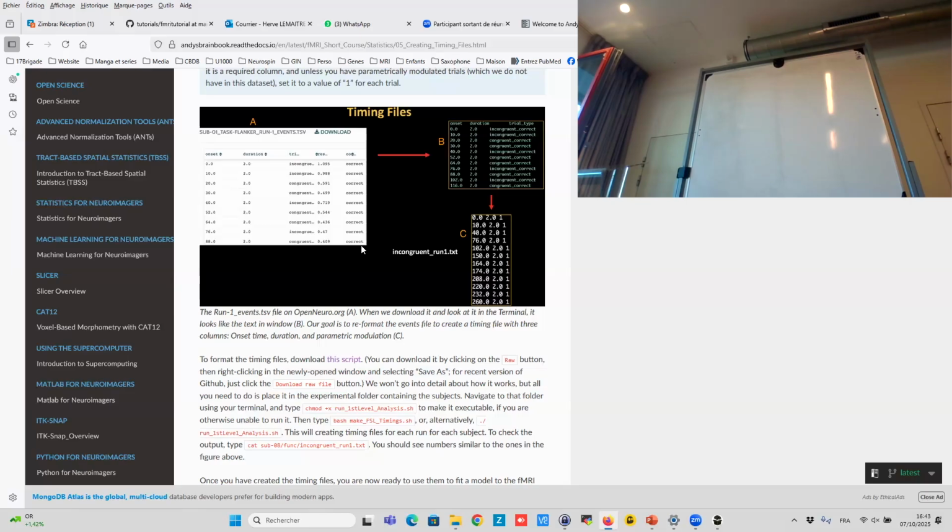Because it's just like a general association of the response. If you want to take into account the response, you need to add another parameter in it, and you can take care of that. For the tutorial, I will not go over that one, but for sure you would not get the same signal for incorrect or correct answers.